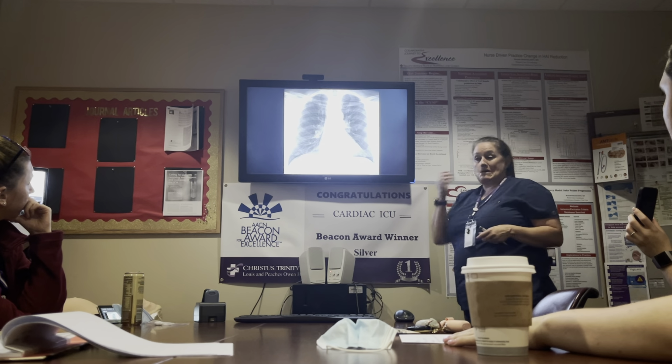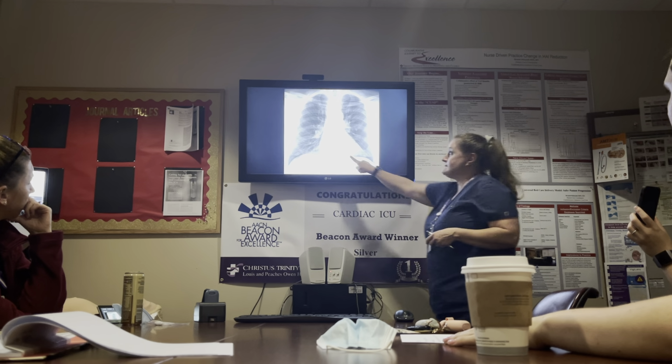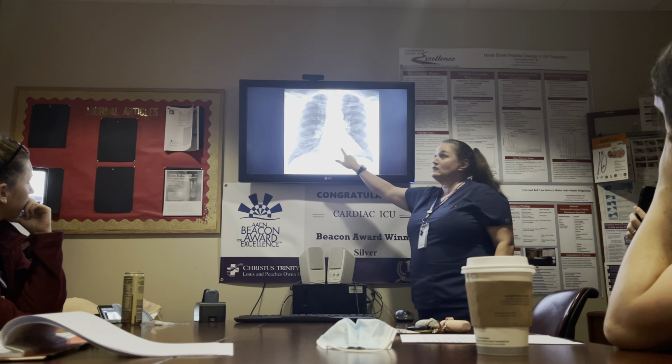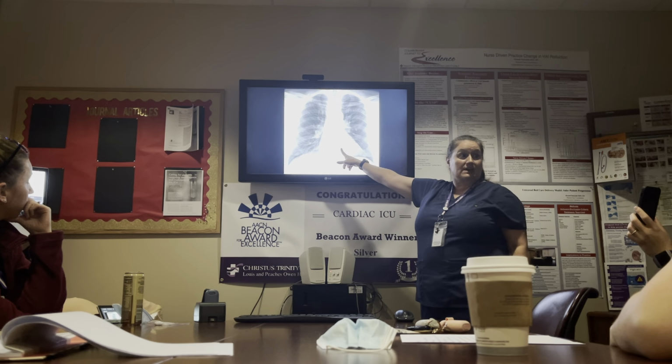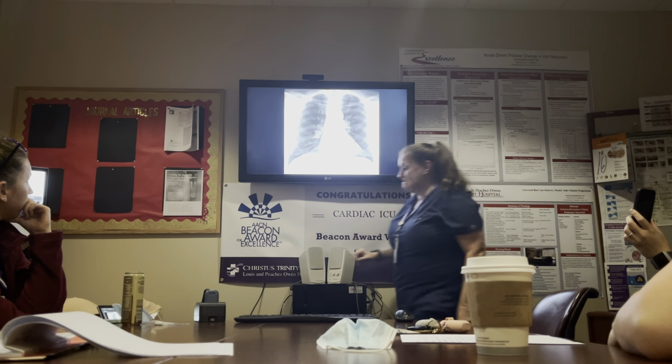Where's the gastric bubble? Not there. It's up. Is it herniated? That's a hiatal hernia. Okay. Okay, so that's what one looks like. That's a little bit more exaggerated than we see, but that's what a hiatal hernia looks like. Okay? All right.